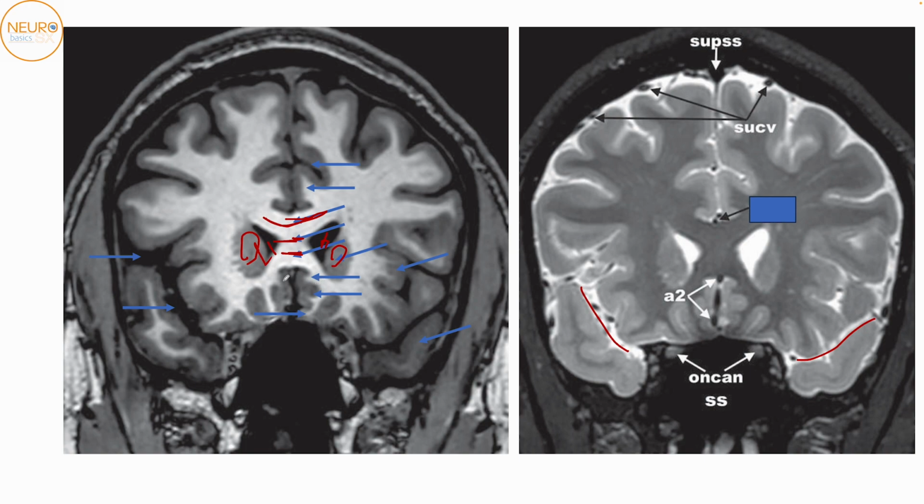Okay. Then below the corpus callosum, there's a subcallosal area over here. This is the insular cortex, and this is the temporal lobe over here. This here again are the ACAs running above the corpus callosum.